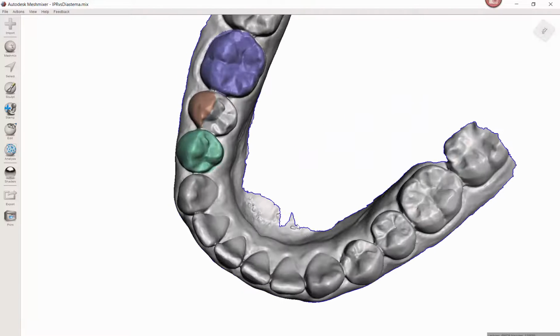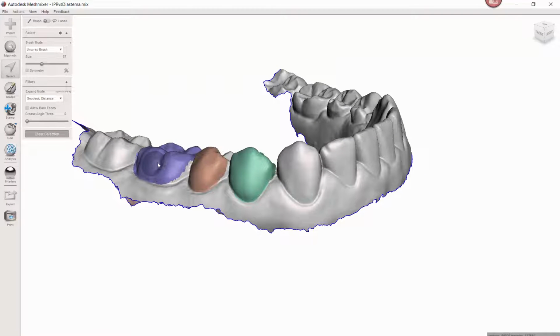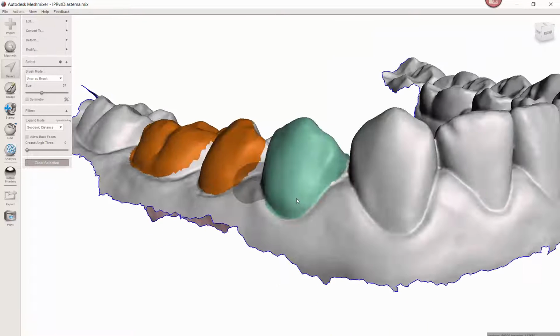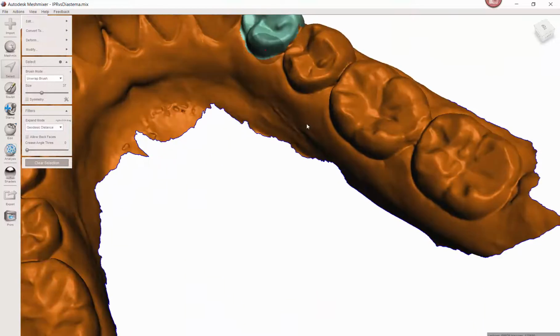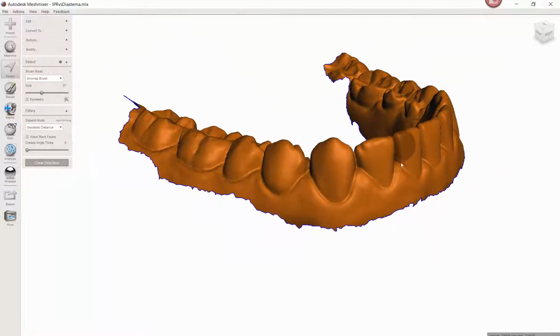And so if I ever want, I can still select like normal and just kind of come across and it doesn't change anything. But if instead I want to individually select a tooth, I can hover over top of any single color, wherever the red dot is, not the entire circle, just wherever my red dot is, if you can kind of see that underneath my cursor, it will select that. Even though I'm hanging off, if I press once it gets both, but if I press it twice, it just selects the color. Same thing if I select the gray, because the gray is one solid surface group. Notice that the green did not get selected because it's a separate surface group. If I want to select everything, I can hit Control A, that's Control All, or Select All. That works in lots of programs. But so this is surface groups.